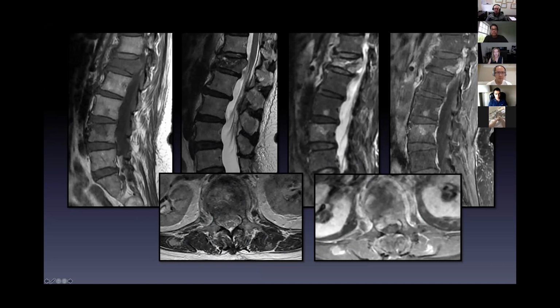All right, so this case, I've already kind of described to you what tumors look like. This was just kind of the classic appearance of Mets on MRI, and I just wanted to go through it quickly. Sagittal T1, it's T1 hypointense. This was a 56-year-old woman who came into the county ER one night. Only history we got was back pain. My fellow said, do you want us to call, see what else is going on? I said, no, there's only one thing this can be, and that's metastatic disease. So T1 infiltration, pathologic fracture.